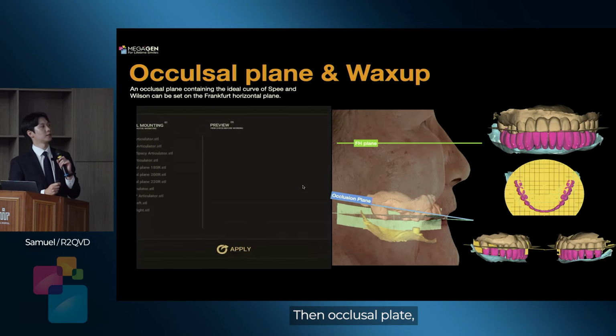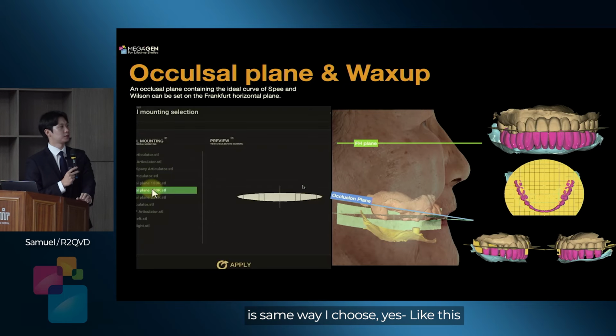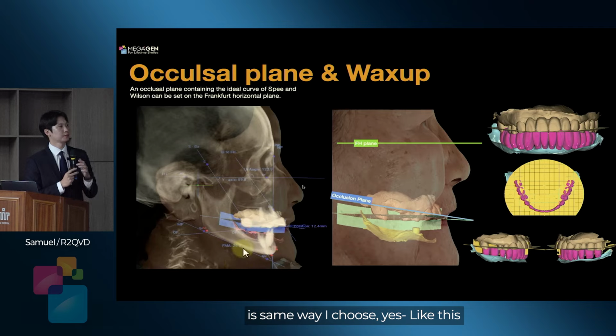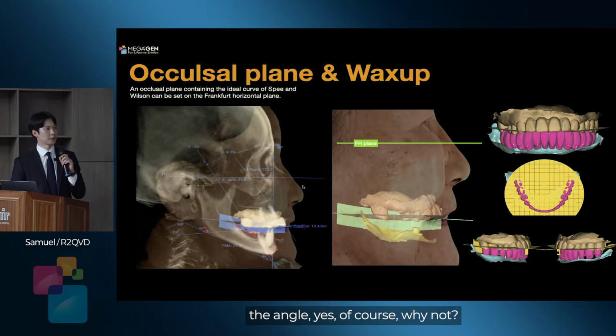Then the occlusal plane. The same way, I choose like this. Then, if you want to change the occlusal plane angle, yes, of course, why not?